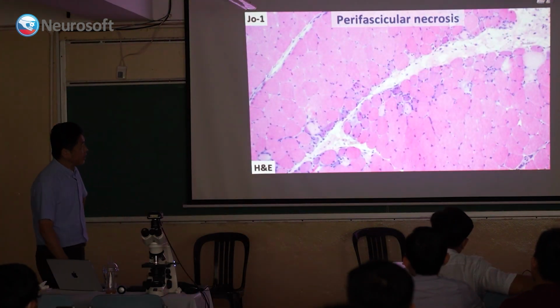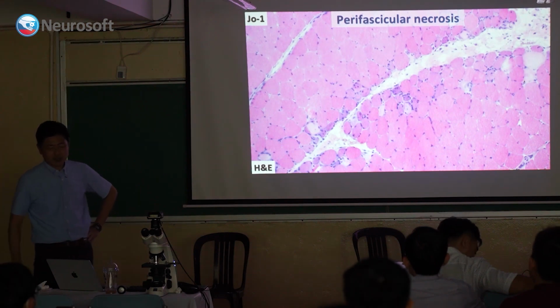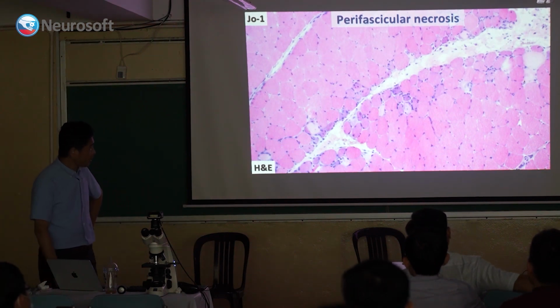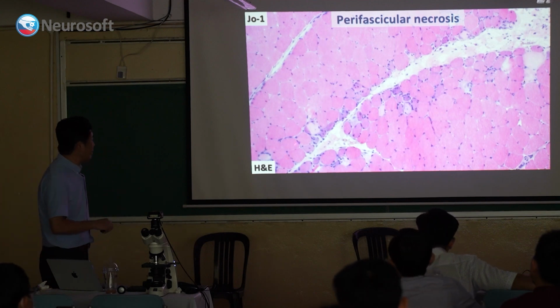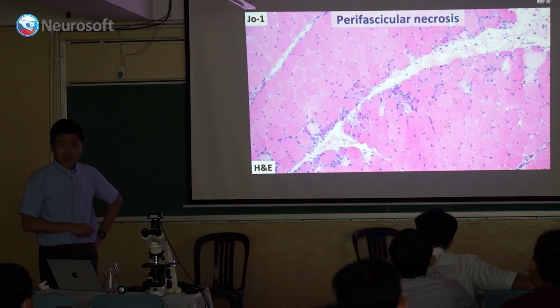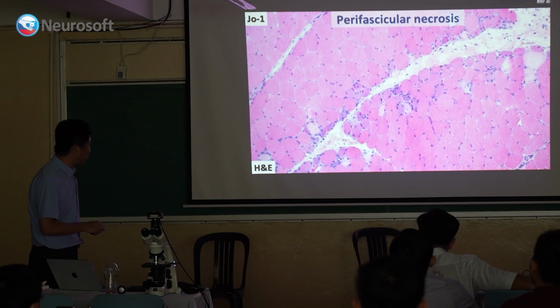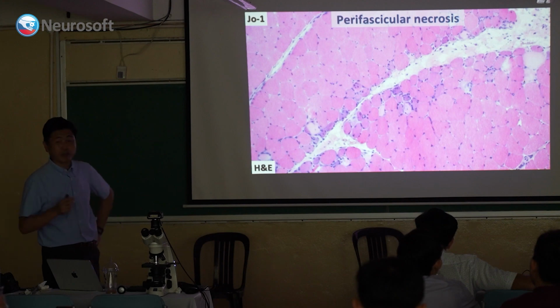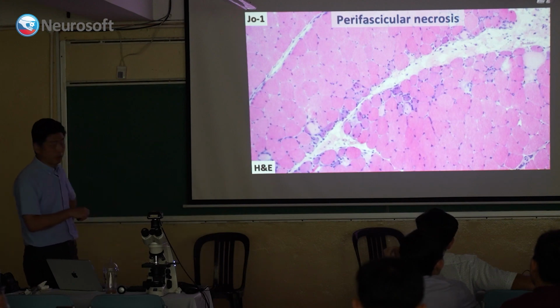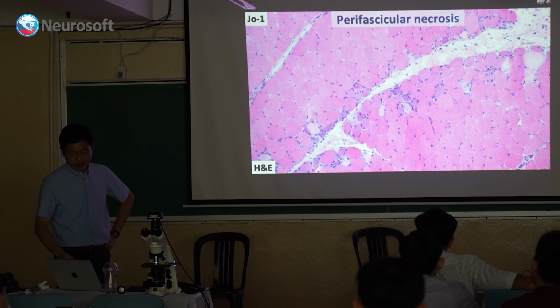Okay, so let's discuss muscle pathology. The most important feature is perifascicular necrosis. For some reason, nobody knows why, necrotic fibers are clustered at the periphery of the fascicles. And if you have necrosis, of course, you also have regenerative fibers. So that's why necrotic and regenerative fibers tend to be distributed at the periphery. By the way, this is JO1 positive cases, okay?